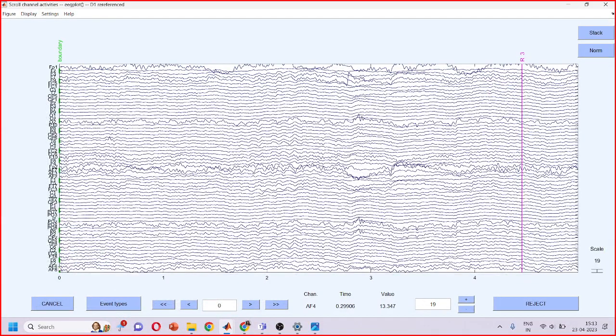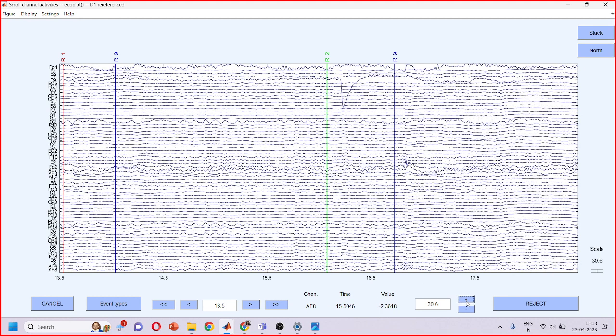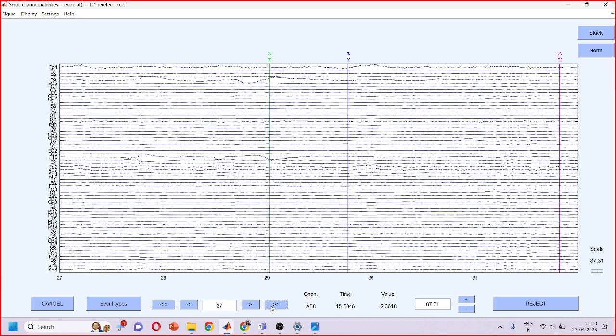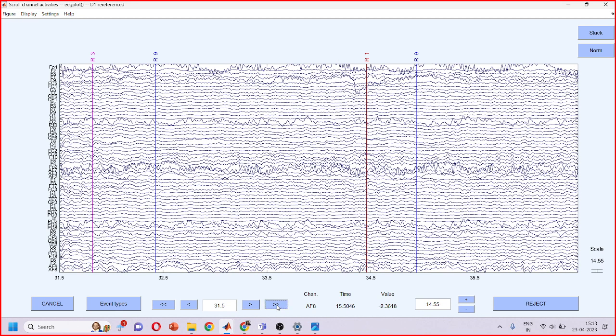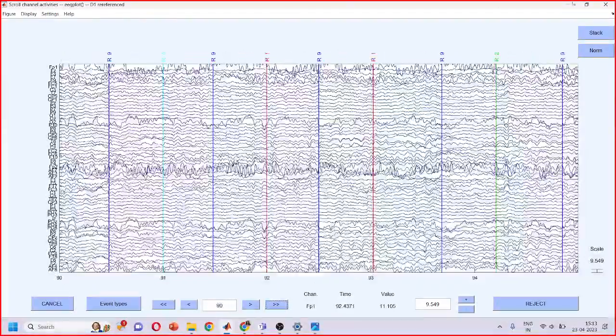Okay, well, the channel that appeared bad is now interpolated, and it's working fine now for us, right? And one of these channels is also acting weird, but I guess we can try to avoid its seriousness because it's acting very weird at very specific intervals, and that can be removed as well. So no need to interpolate the whole channel. The data looks good to me.